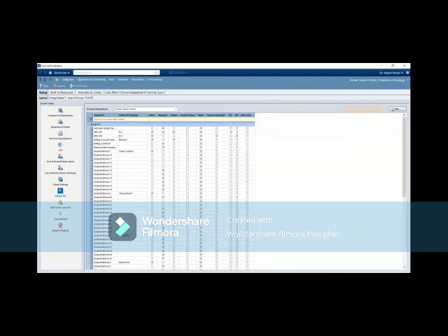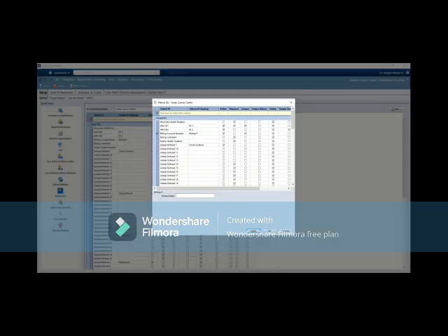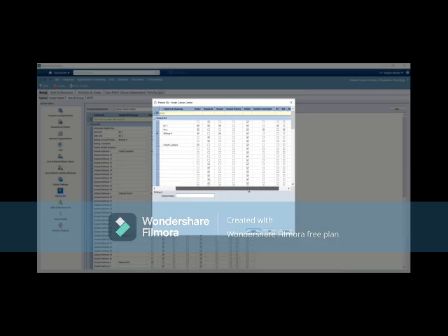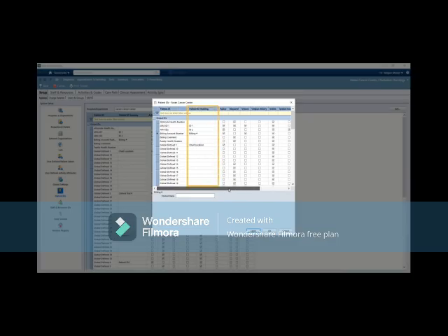Select Edit to add or edit a patient ID. To indicate ID1, check the box under the column labeled ID1. Check Active. Visible will automatically be selected when the ID is marked as active. Check Required to make the ID mandatory when entering new patients. Type the label in the Patient ID header field to enter the label that will display in the registration workspace.